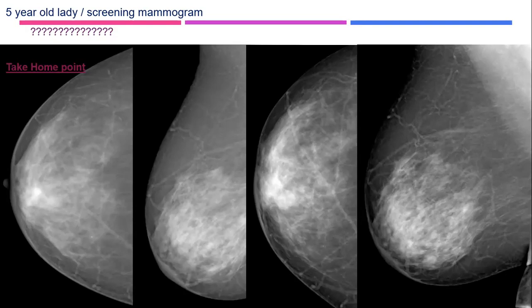I think yes. If you could see a mass on a single view, you will call it an asymmetry until it proves all criteria by being visualized in the two views. If you could not appreciate it, you will still call it an asymmetry, even if it looks like a mass.